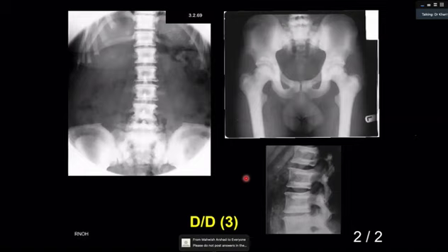The cyclic pattern will give you normal bone density versus sclerotic bone density at particular parts of anatomy. You will get this bone within bone appearance in the vertebrae like this. You can get lucencies at the metaphyses, which are perpendicular to the long axis of the metaphyses.